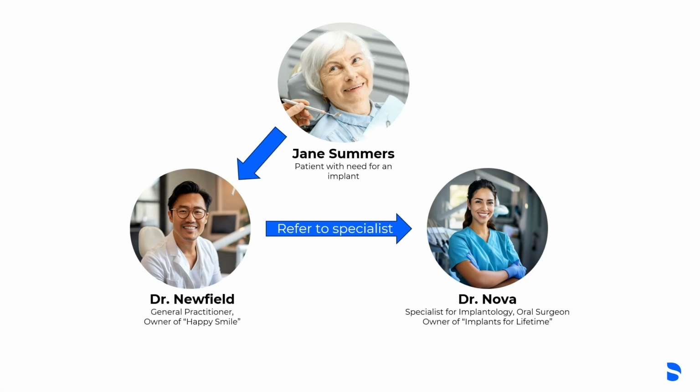Dr. Newfield is a general practitioner in the dental practice Happy Smile. He acquires a CBCT of his patient Jane Summers. While diagnosing this CBCT in Sidexis 4, he recognizes that this is a complex implant case. He wants to refer to Dr. Nova, who is a specialist for implantology in the practice, Implants for Lifetime. Let us have a look on the workflow when involving DS Core.